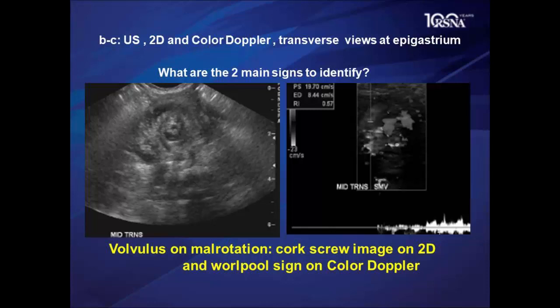And then some contrast went through. The duodenojejunal junction is not here, but to the right side. Okay, so two main important signs. Now the volvulus, a surgeon would tell you it's maybe 3 turns, maybe 2 turns, maybe 270 degrees. So the volvulus could be more or less loose or tight or multiple. This is important because volvulus could be transient, and then there is a devolvulus, similar to the torsion and detorsion of a testicle or of an ovary.